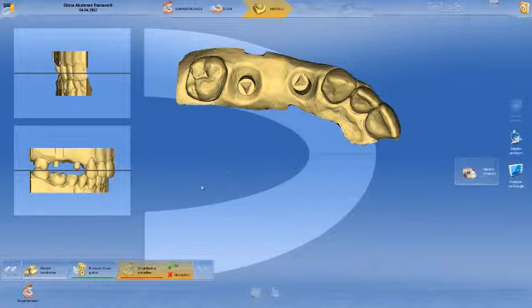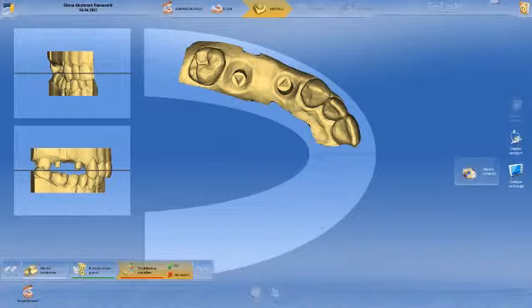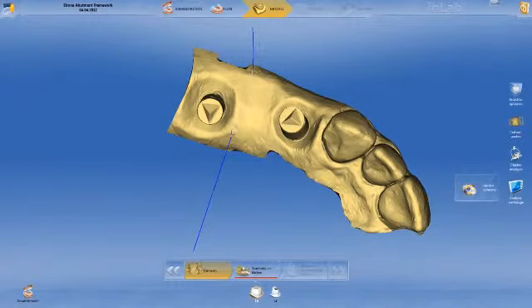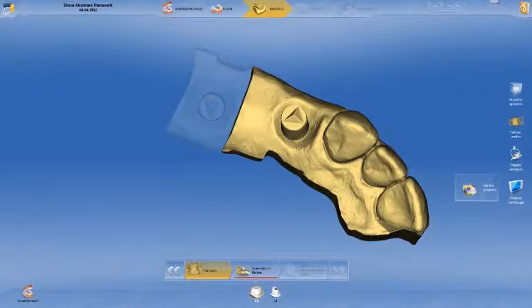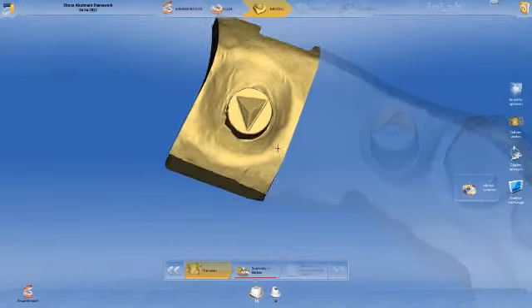Model axis alignment. Here, I determine the alignment in my quadrants mesially and distally, as well as the alignment in the articulator. To this end, I use the settings from the articulator and click on OK. In a second step, I determine the area of my gingival mask for 16, which is highlighted yellow. Double-click to start, click once to fix, and click twice to end. If the wrong area has been cut out, double-click, and the scan body is reactivated.